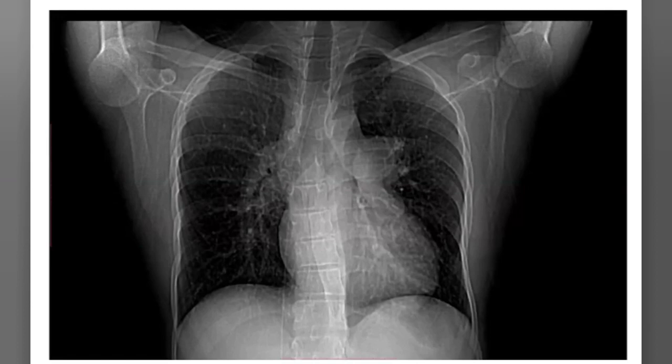Sir, I will ask the patient about fever, cough, and night sweats, whether it is some aneurysm lying in the region of the pulmonary artery, Rasmussen, if he has a history of TB. But to me, the lungs appear clear as such, other than small tiny nodules, which are mostly vascular. These are just end-on vessels, I think. Okay, fine, sir.